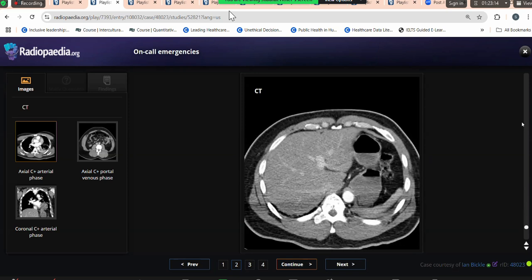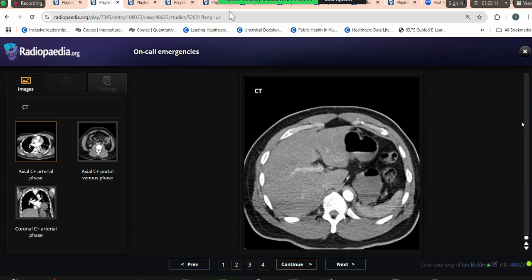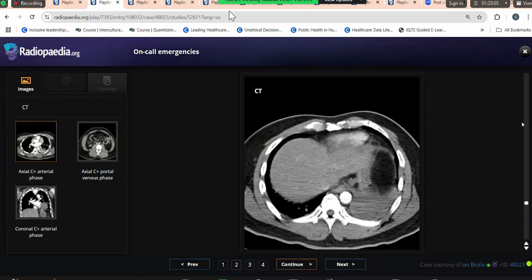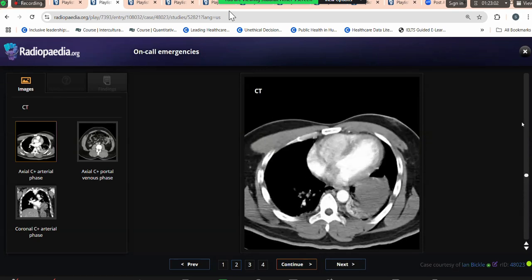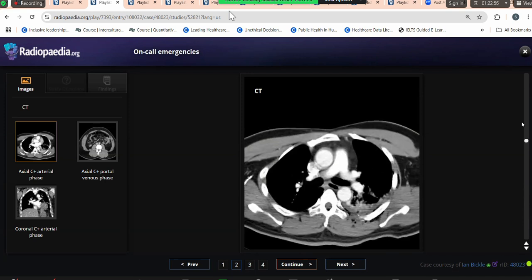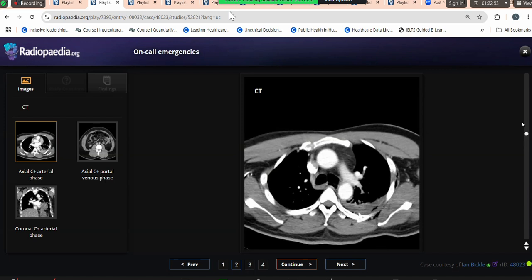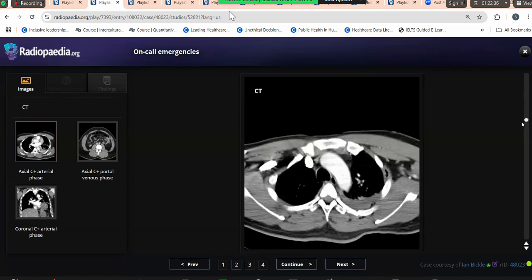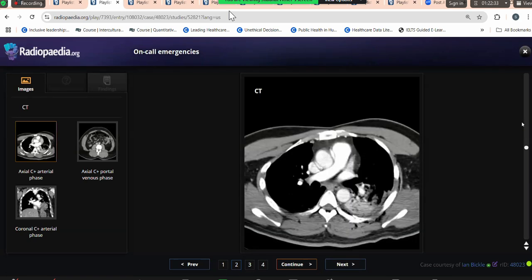Scrolling further inferiorly, the visualized part of the liver and the splenic parenchyma appear normal. I can appreciate a few left-sided fractures as well, with associated pulmonary contusions. In routine practice, I would like to see the lung window to rule out any pneumothorax, as it is a case of road traffic accident, and the bone window to look in detail for fractures of the ribs, the vertebra and the bilateral scapula. However, in this given window, I cannot appreciate any major vascular injury, as the mediastinum appears normal.